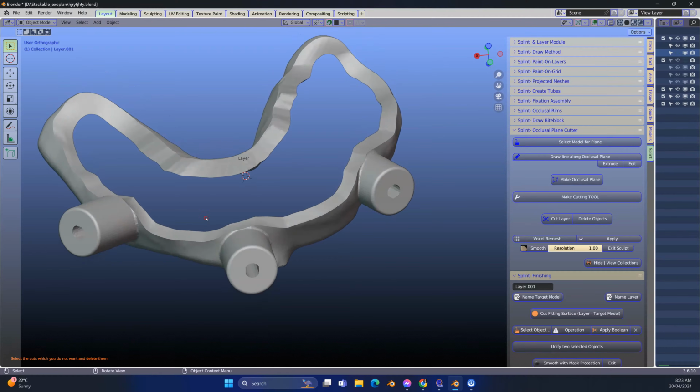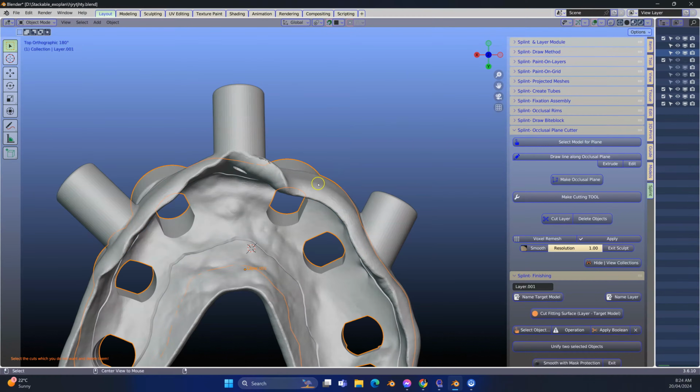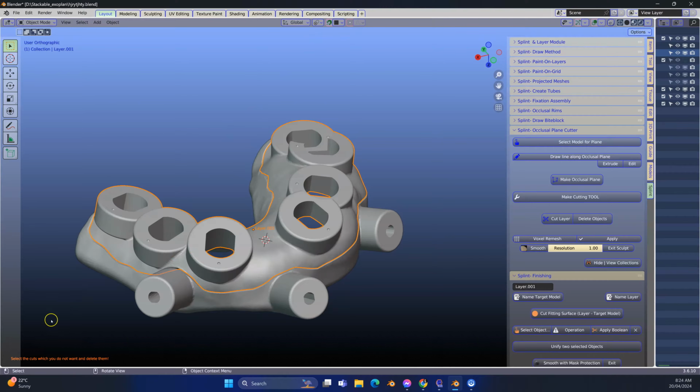So this may take a little bit of time and practice for you to wrap your head around how to split this. But if you think of it as a piece of material that you can manipulate, then it makes it much easier working with proportional editing and the magnet tool. Next, let's make this into a stackable.